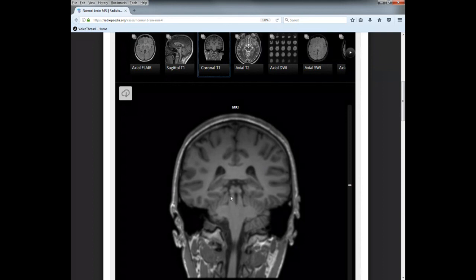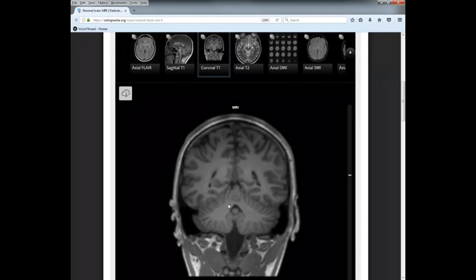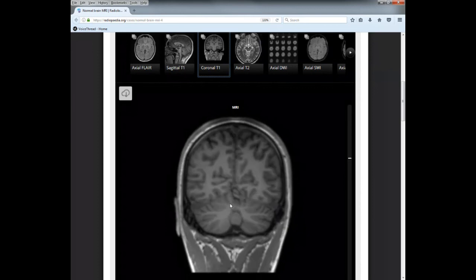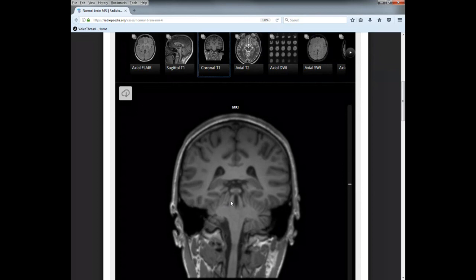So fibers that come from the dentate nucleus, which is right in here. You can see this little bit of gray area in each hemisphere. That's the dentate nucleus. It connects in through these fibers to the peduncles right there, the superior peduncles. And then it comes through the thalamus, which is like your relay station for sensory stimuli, going up into the frontal lobe.